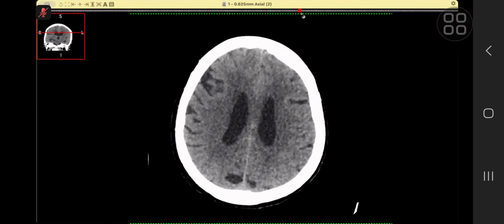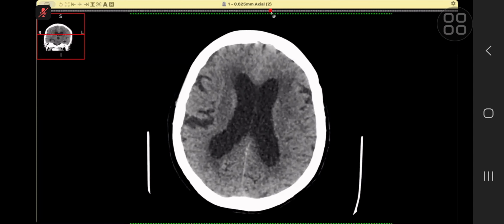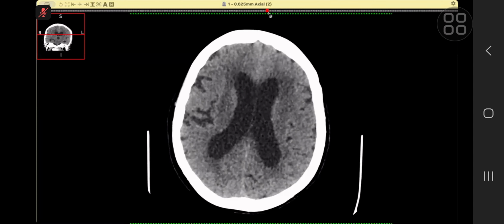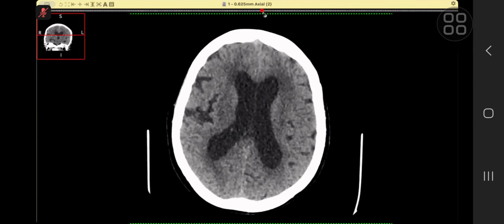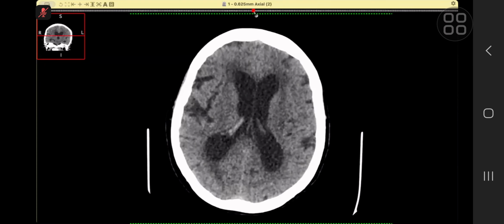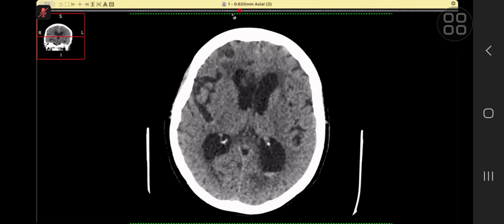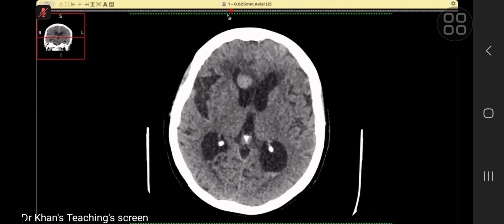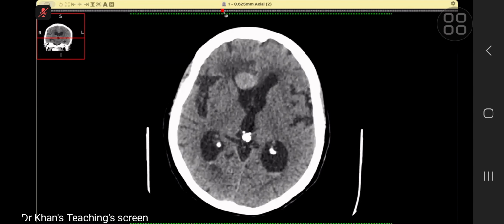Based on these findings, this is likely an intracerebral hematoma seen in the right frontal region with intraventricular extension in the form of occipital horns of bilateral lateral ventricles. There is no evidence of any obvious midline shift. There is some focal perifocal edema with effacement of the frontal horn of right lateral ventricle. I would like to immediately pick up the phone and call the referring clinician and inform him the findings.